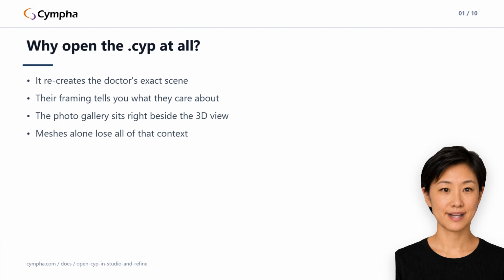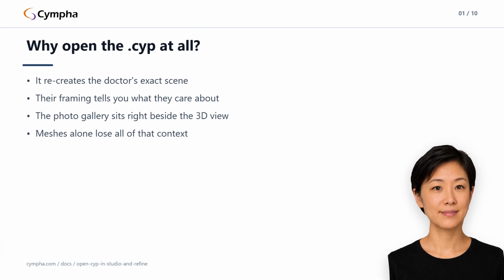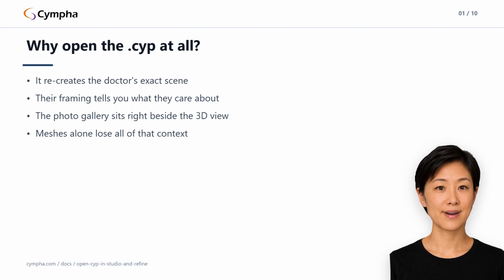Second, the photo gallery is right there. You can flip from the 3-dimensional scene to a clinical photo and back without leaving the browser. 30 seconds in the doctor's scene is the cheapest context you will get on this case, so let's go get it.